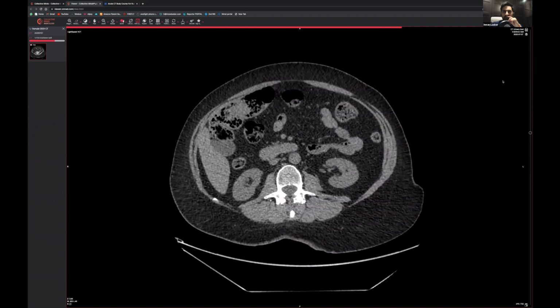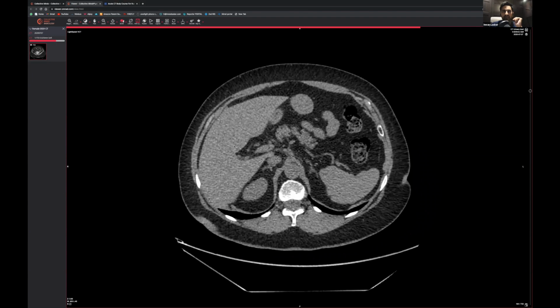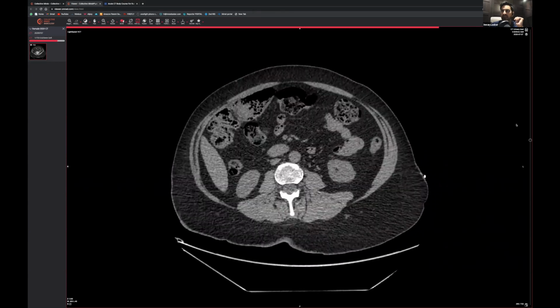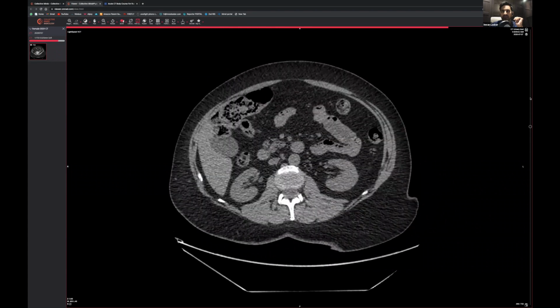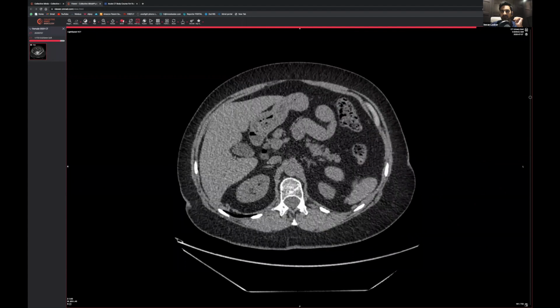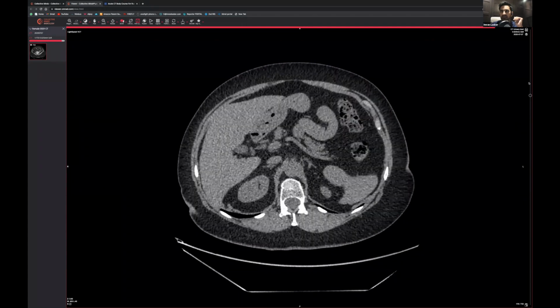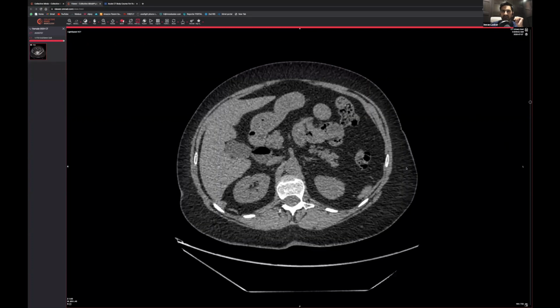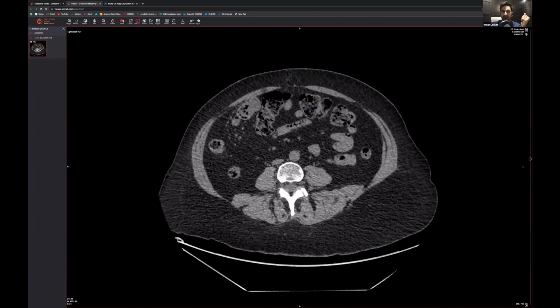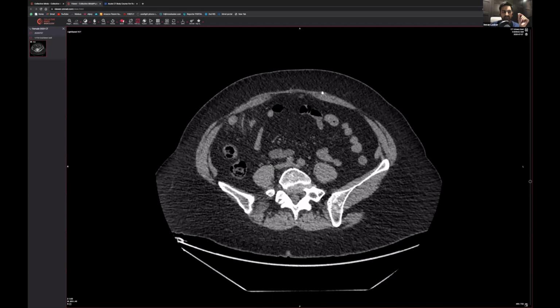And so we just do the usual things, try and make sure that we have looked around. So the gallbladder looks okay, doesn't look like there's much in the way of fat stranding. Let's have a look at the pancreas. Pancreas sitting over here, okay, and that looks okay. Doesn't look like there's any fat stranding there at all. So that's good. And then the kidneys, let's have a look at the kidneys. I mean, non-contrast, sometimes you get people who do a non-contrast scan of the patient lying on their back. I've been at one trust where they've done that.